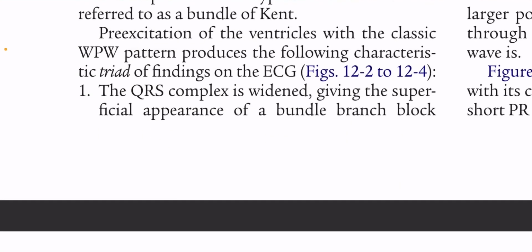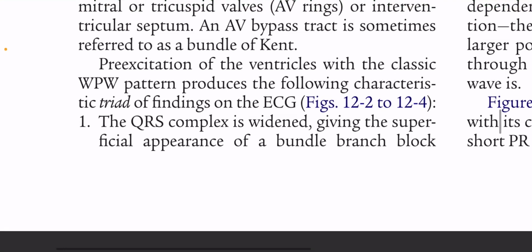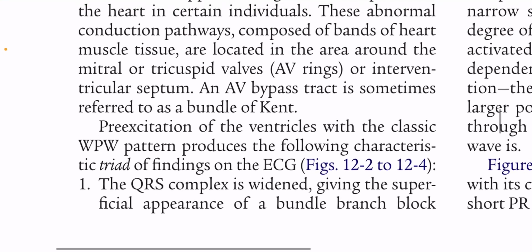Pre-excitation of the ventricles with the classic WPW pattern produces the following characteristic triad of findings on the ECG. Key triad: the QRS complex is widened, giving the superficial appearance of a bundle branch block.